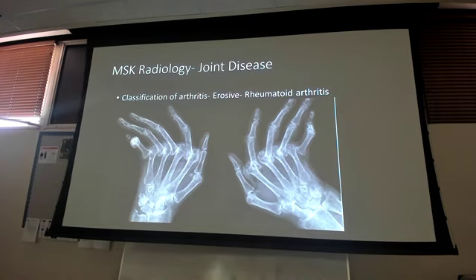arthritis. Now, good news is, you guys will learn in endo and stuff like that, and ortho a little bit, labs and things along those lines, and clin lab of how to diagnose this based off of symptoms and labs before it gets this bad. But you may end up seeing patients with this. So this is rheumatoid arthritis. What's going on here? Anybody know?